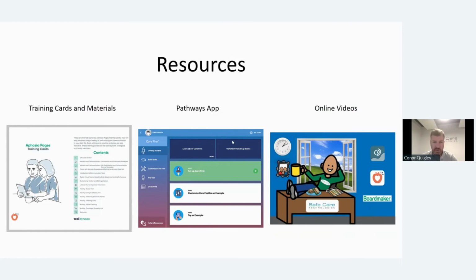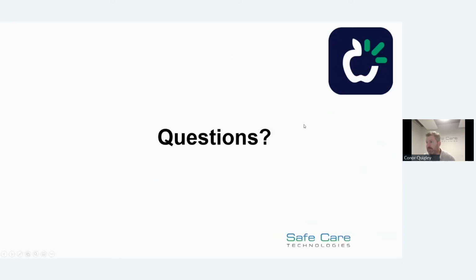It's not designed for the user, it's designed for the therapist, the teacher, the parent, on how to use TD Snap, how to make those edits, how to make those changes, how to customize it. But it's also got lots and lots of lesson plans, and we also have some online videos on our website and on our YouTube channel. So it's worth subscribing to us, and you'll find some useful resources there.